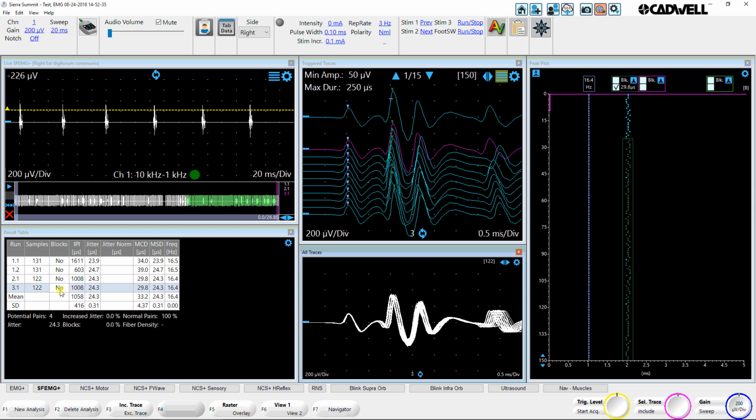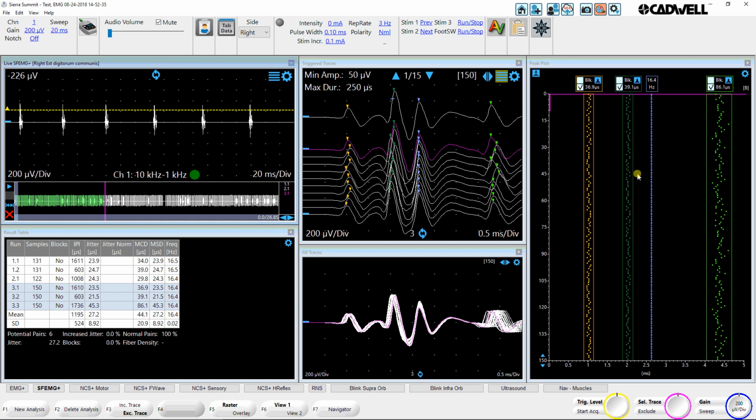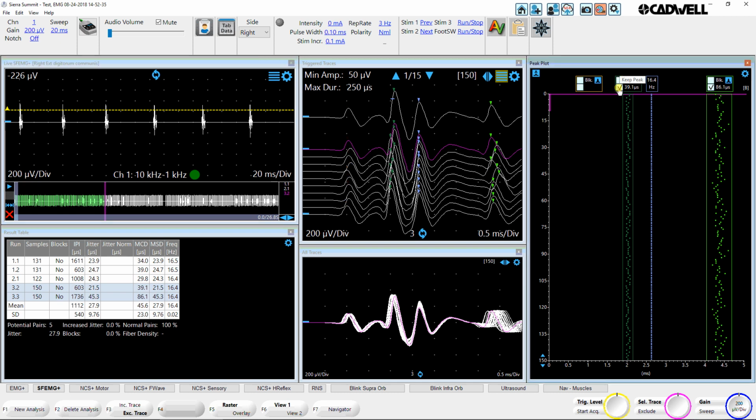So there was the one I just did. This is a copy, and on this one, I'm actually going to either readjust my trigger or just refresh my buffer. So now I see all of my peaks again. And in this peak, I actually want to just compare this peak and this peak. So I'm just going to uncheck these two.